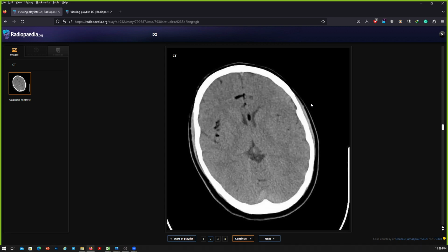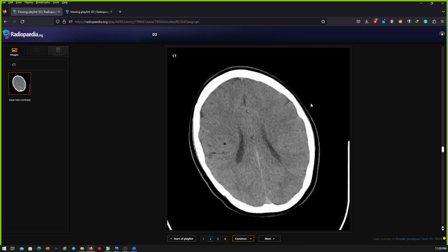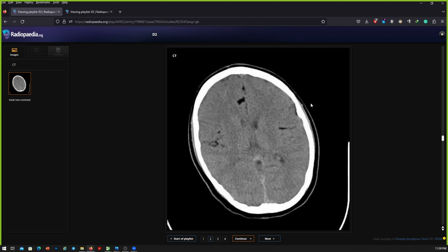Okay, so what is your diagnosis? So this is a case of ruptured dermoid cyst. I will convey my finding to the treating physician because this may cause a chemical inflammation. So I will pick up the phone and call the treating physician for the neurosurgical referral. Okay, will you pick up the phone quickly, urgently, or can you delay for 2 hours or 3 hours or maybe a day? No, quickly, immediately, I think. Okay.